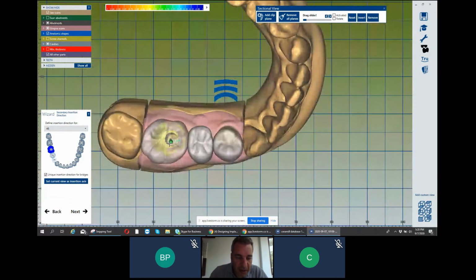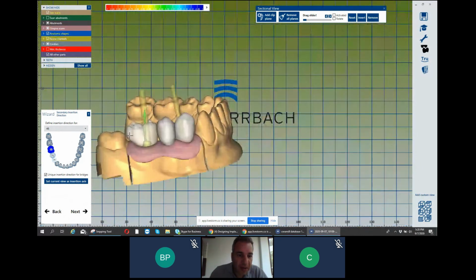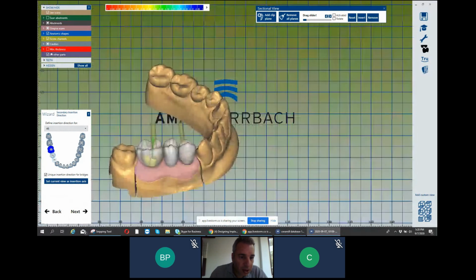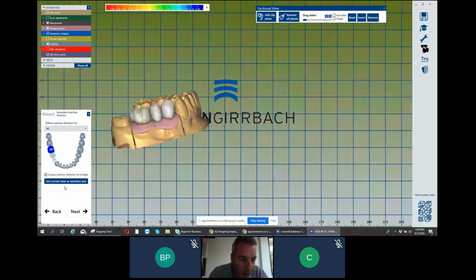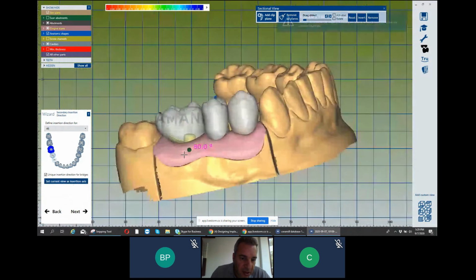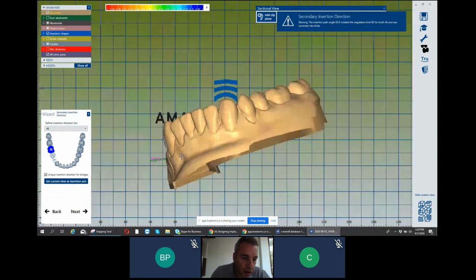When we have abutment with screw retained, I prefer to check with the screw channel. So with the screw channel, it's better. You see here the screw channel, so I can follow the screw channel, which is better. Okay, without screw channel. And now when you check, you go next. You don't click on set current view, because if you check it manually and you click set current view, you see the arrow will be from this side, which is wrong.